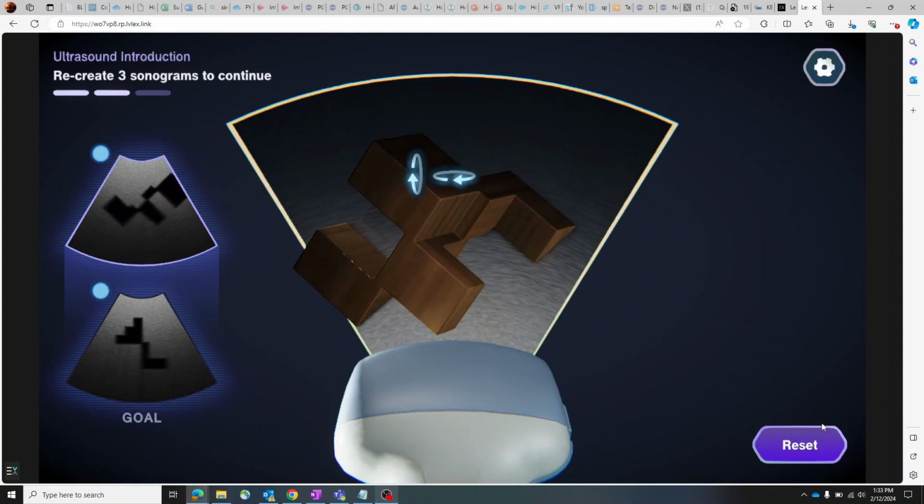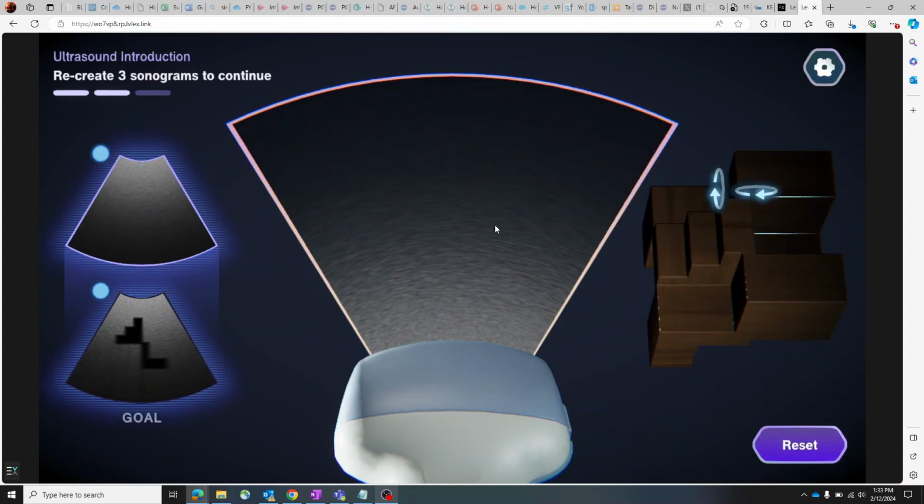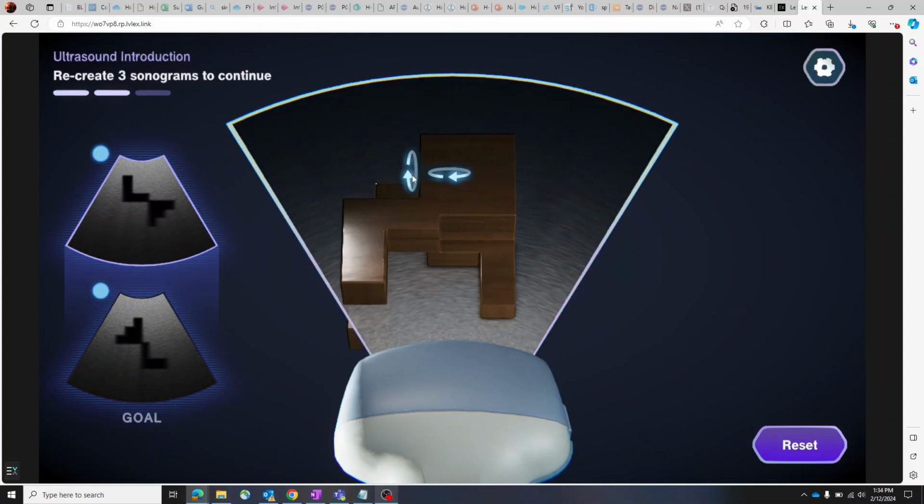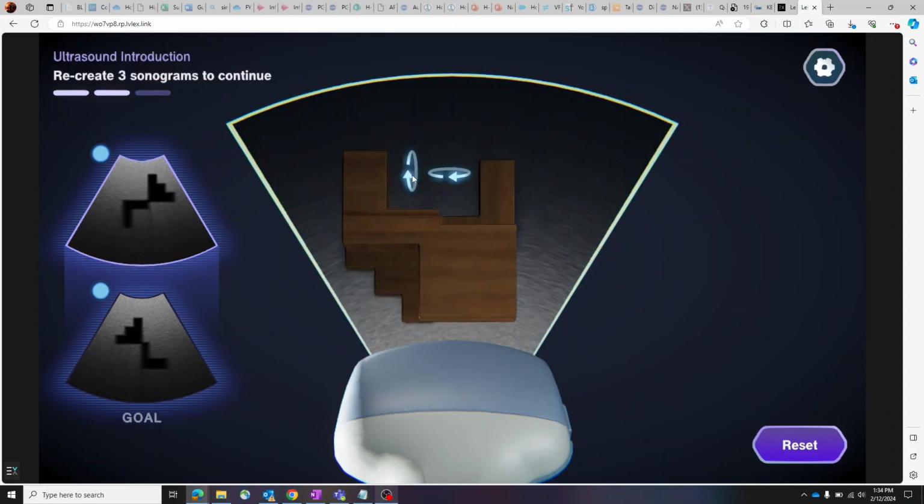You can see that we are now trying to get closer to what the real scenario would be like, more organic shapes within a more complex form.